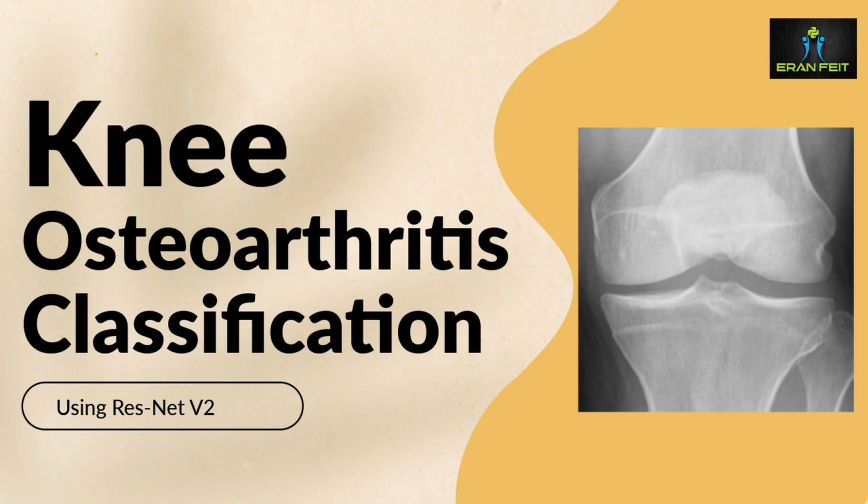predict random test images. Finally, we will wrap up with a full classification report and confusion matrix and see how well the model is doing. So, let's start with a short demo.